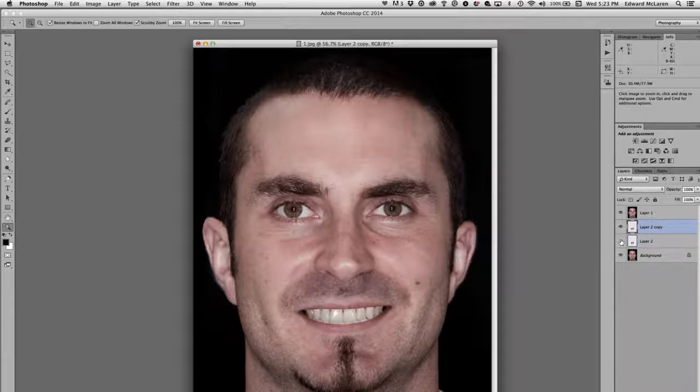We're going to just turn this one off. And the patient says, nah, it's just a little too long for me. I like everything, no problem. Highlight it, Command or Control T. Turn on the transform, and just shorten it a little bit at the edge right there.